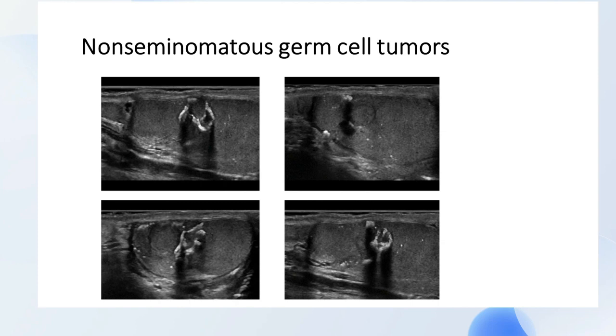You can also see these calcifications inside the scrotum or in the tunica vaginalis space, and that will be called scrotoliths. So these are just stones. They can also develop there, just like what they do inside the gallbladder or the urinary bladder, for instance.